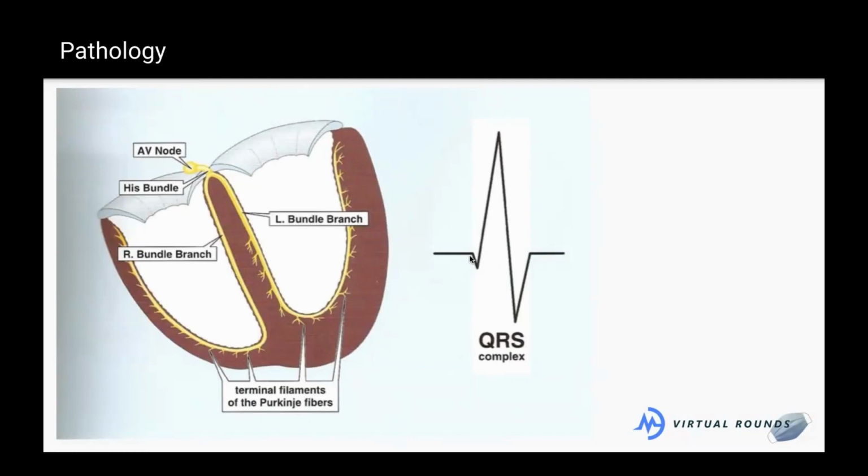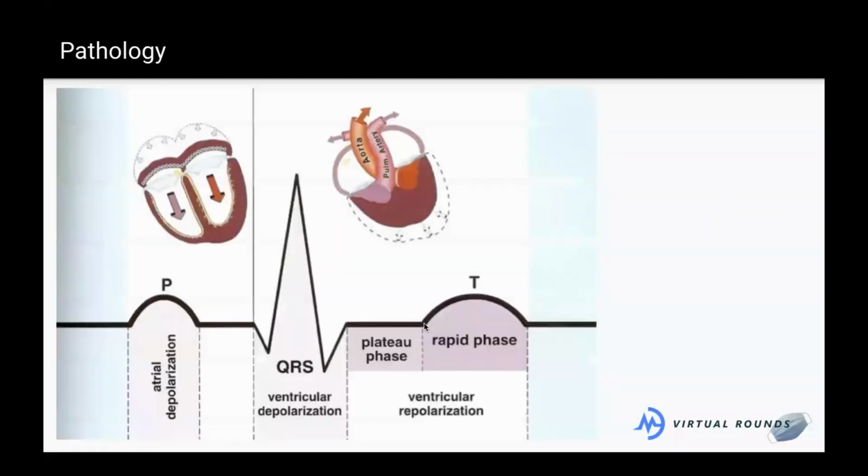So this Q wave, don't get confused if you don't see it on every EKG. You can impress your friends: if you have a Q wave, which is this little part down here, that means that you've had an MI in the past. So not everyone has a Q wave. I don't think I have a Q wave most recently that I've checked. I hope not. So this is not always there. Don't be confused if it's not. We still call it the QRS complex, even if there's no Q wave. So this big bump is basically the bottom of the chamber contracting.